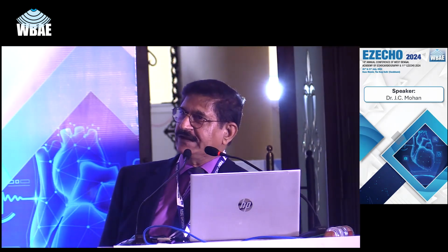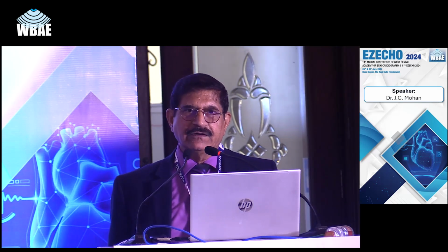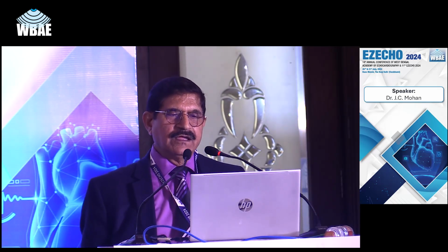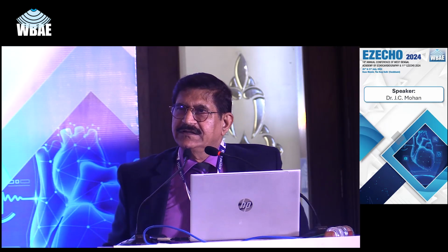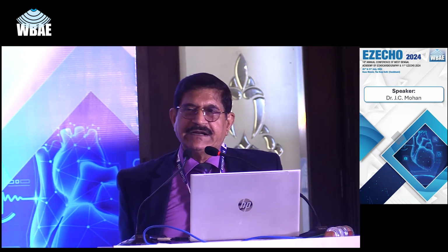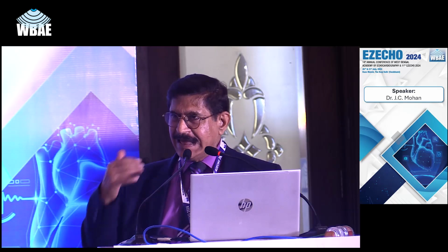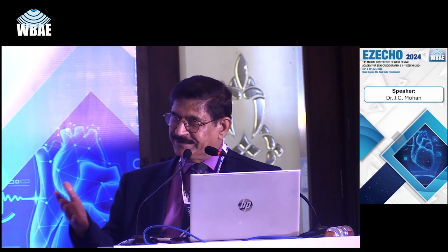Markedly increased T2 values, thickened right ventricle anterior wall, thickened septum, thickened anterior wall of the left ventricle, and you see the degree of edema or inflammation, the water content in the right ventricle myocardium and left ventricle. That is very unlike amyloidosis. It's not hypertrophic cardiomyopathy.